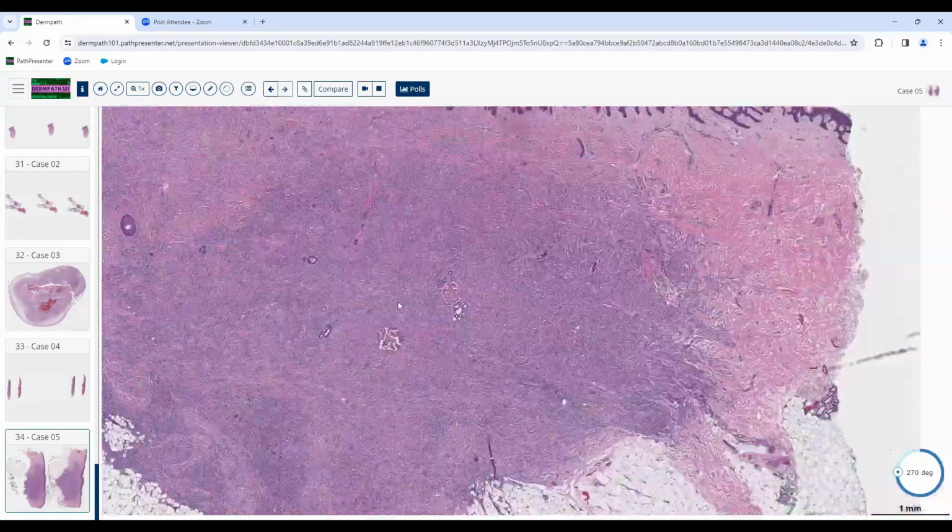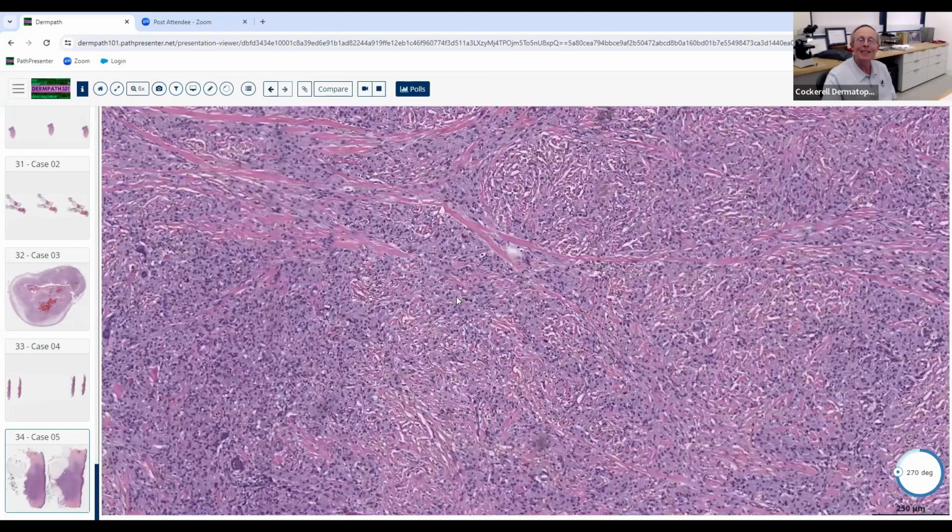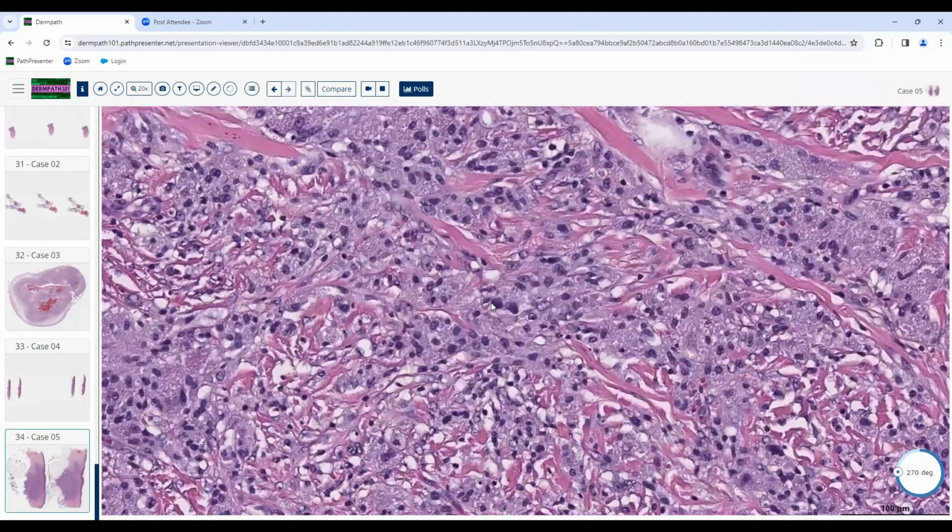Astrocytoma. Well, you said granules. I was hoping you'd take that to the next level. Granular cell tumor. Granular cell neoplasm. This is a granular cell tumor. What are these granules? Bonus question.